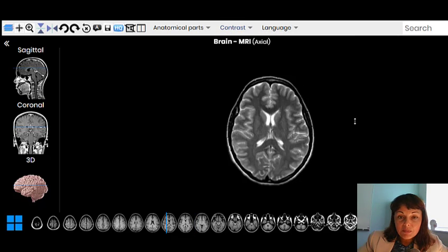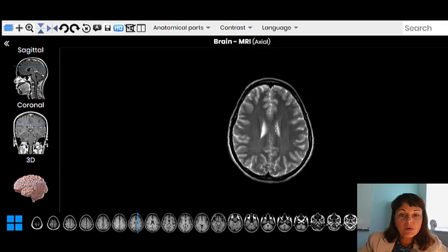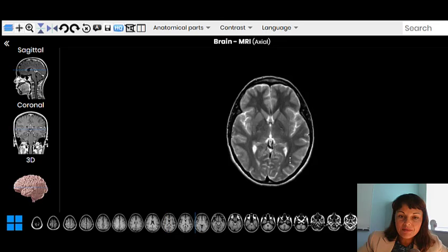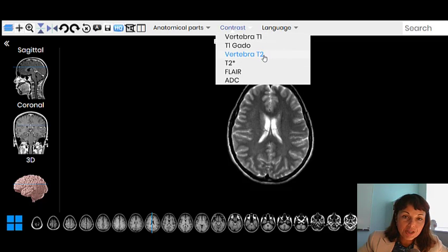The T2 weighted images allow us to see the edematous and normal fluids easily and quickly. As here, for example, you see the cerebrospinal fluid inside of the lateral ventricles and all through the ventricular system of the brain, right? And you also can see a thin line. This is our subarachnoid space. It continues all over the gyri and sulci, right? Here it is. If a patient has trauma, edema in one area, this area would appear bright as well because it will have some edema, the post-traumatic edema. And it's easy for clinicians to look through the T2 weighted images and identify the pathology quickly.